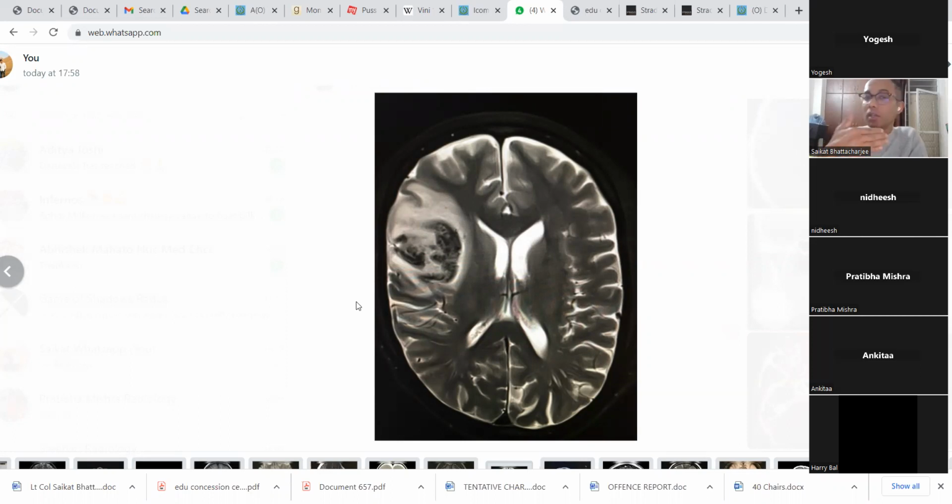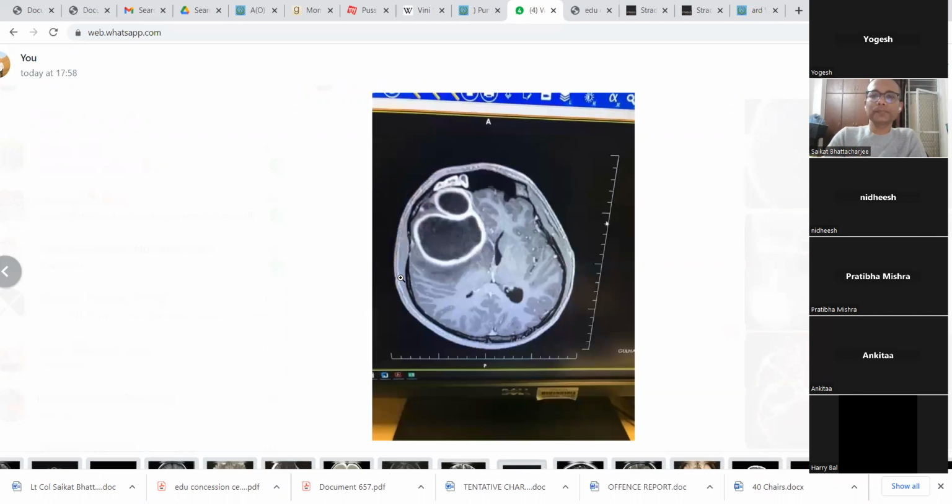CVT, sir. CVT, excellent, very nice. I was looking for that. This might be a cortical bleed. If the patient is hypertensive, then you must entertain that too. But with this kind of vasogenic edema and a cortical-based bleed, you must always think of a CVT and evaluate accordingly. Had there been multi-compartmental bleeds, think of coagulopathy, drugs, vasculitis, etc. But these 4 or 5 things must cross your mind, and why not trauma also. However, this area is not usually affected by trauma unless it has been a direct trauma.